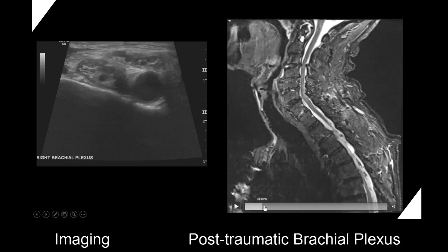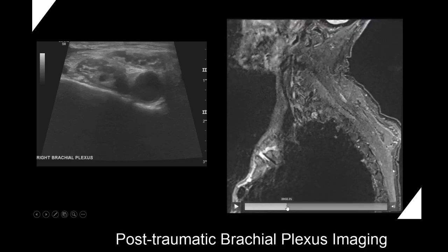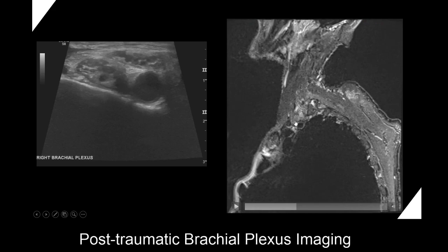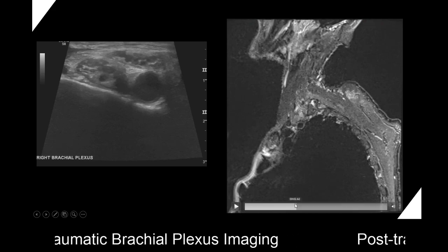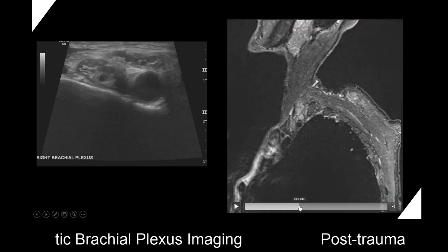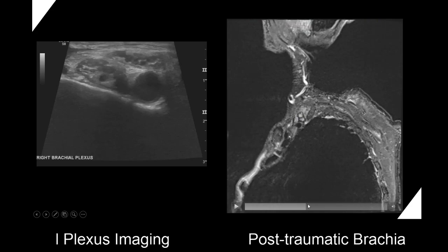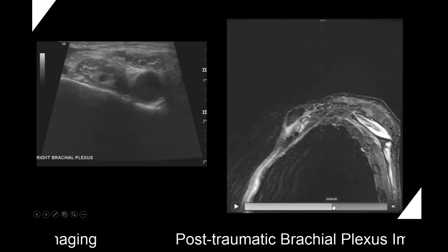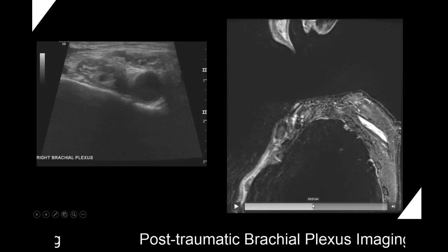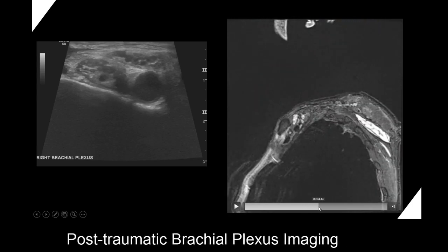We did an MRI, and as you follow these nerves out, you see C5 and C6, and they are going to disappear right there, but those bulbous nerves, right inferior and lateral, are going to seemingly emerge out of nowhere. So right there, you see them emerge, and then as you keep going forward, you're going to see that anterior nerve emerge further out there, right there. So we're dealing with transections of C5, C6, C7, and T1.